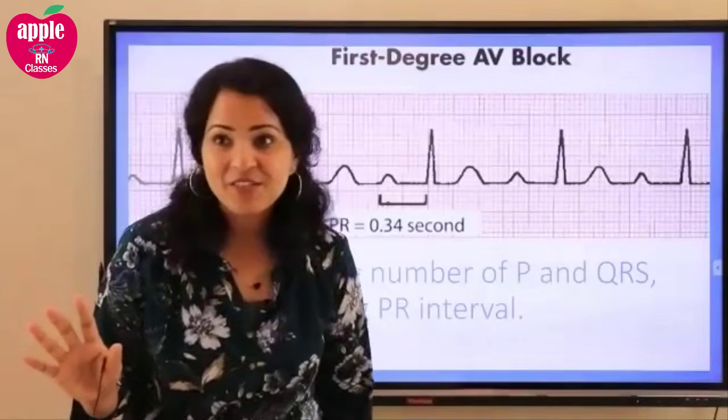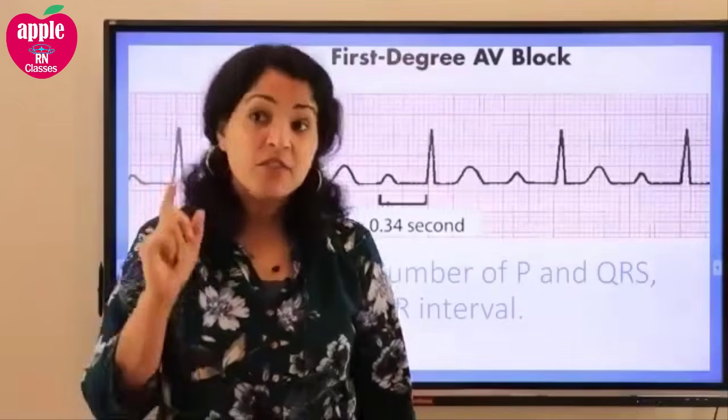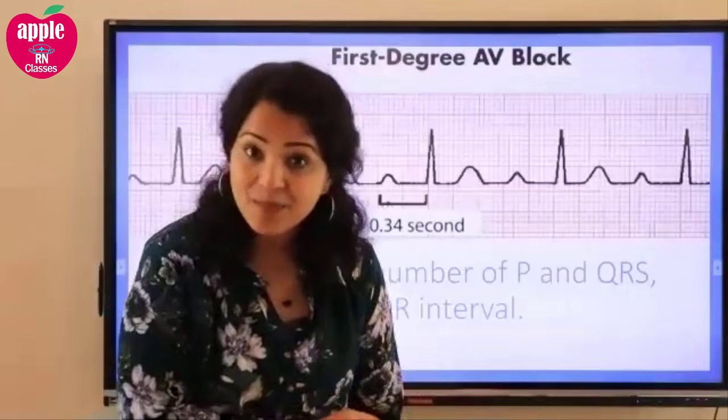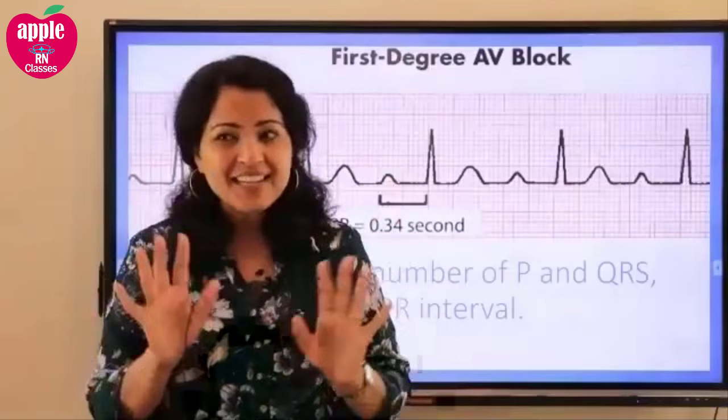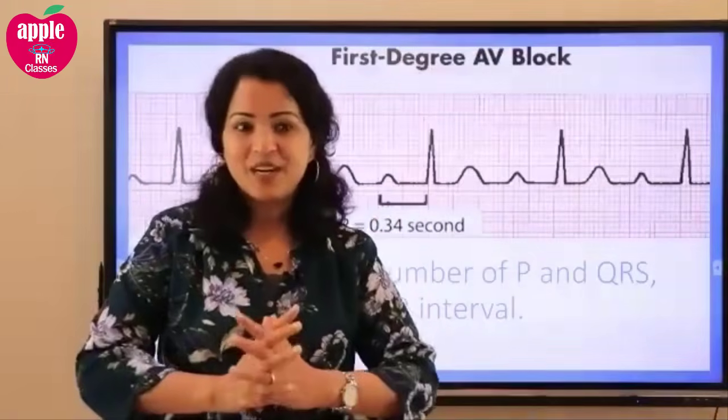Is that clear to everybody? First degree AV block. We will do more examples later, and then we will figure out if we can get it. But I think at least it's clear to you, right? So just that much.